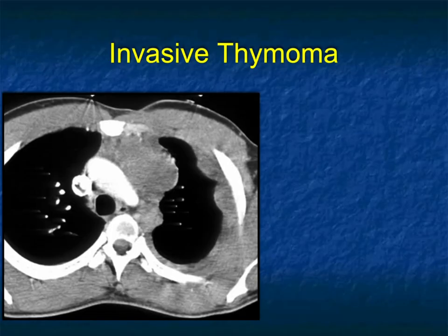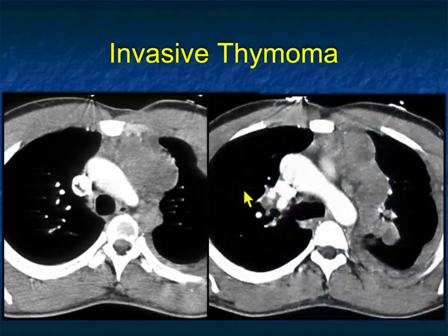Now, I mentioned in the last case invasive thymoma, and you can see that over here as well. So let's do this. I want to talk a little bit more about invasive thymomas, make a few more points, and time is running late. So let's stop here and let's come back and pick up our talk, talking about invasive thymomas.